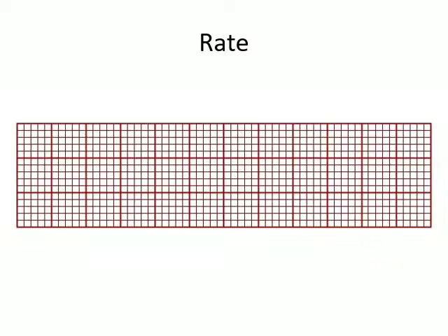Let's move on to something really easy but really important, that is how to calculate rate from the given ECG. I'm going to take a 1 second pause and draw two beats of a normal ECG, two successive beats of a normal ECG. So these are two successive beats that I drew.